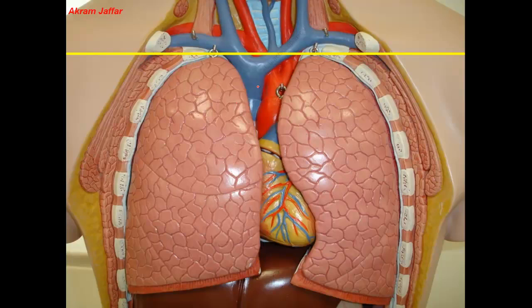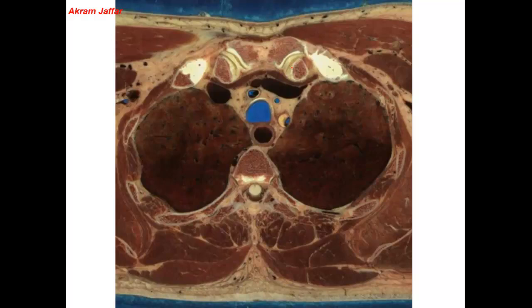veins. An important point here about the brachiocephalic veins is that you can see that there is a left brachiocephalic vein, which is longer, and it is set obliquely, and a right brachiocephalic vein, which is shorter and is more vertical than the left brachiocephalic vein. So in a horizontal section, the profile of the right brachiocephalic vein will be more or less circular, while that of the left brachiocephalic vein will become more or less oval in section, because it is set more horizontal than the right brachiocephalic vein. So here we are.